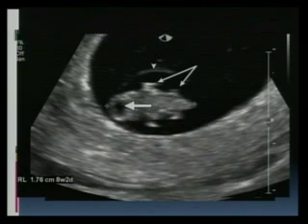All right, looking at this 8 week, 2 days. So 3 things were to happen at 8 weeks, if you remember. Segmentation of the head with the rest of the body, number 1. Appearance of this lucency in the head. What is this, Yemisi? Rhombencephalon. That is why I know this is the head end and this is the tail end, because rhombencephalon occurred in the head end. What are these, Tom? The limb buds. Very good.